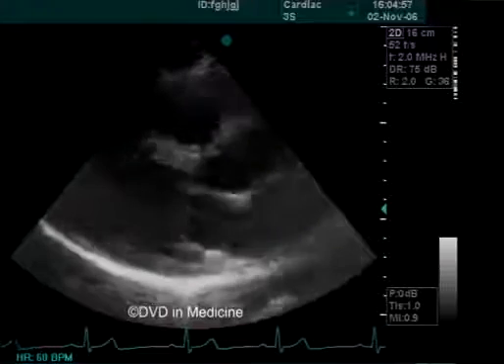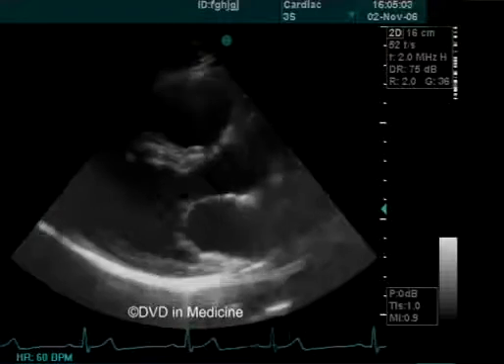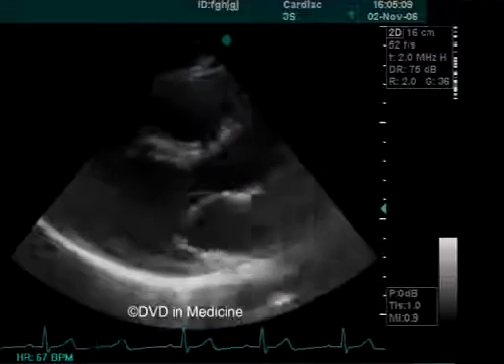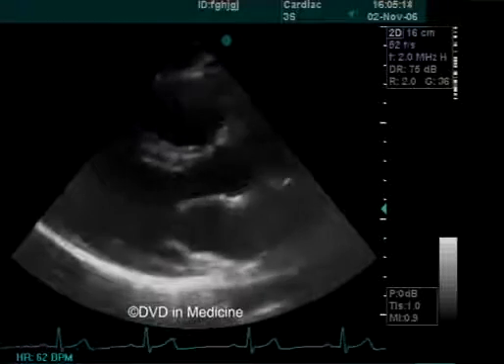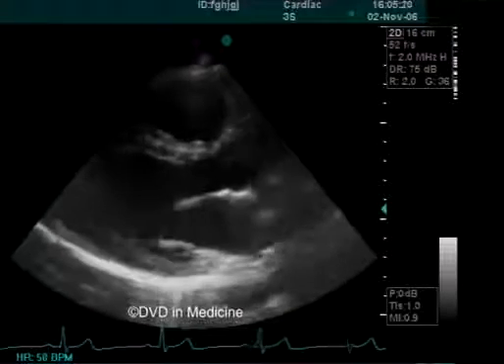4. To assess left ventricular systolic function. 5. To determine the amplitude of motion and thickness of the interventricular septum and posterior left ventricular wall. 6. To see membranous defects of the interventricular septum. 7. To confirm mitral aortic fibrous continuity. This is important in the diagnosis of some congenital heart diseases.